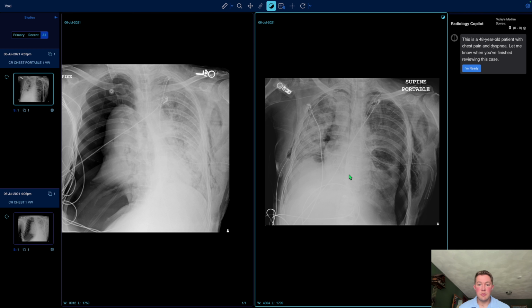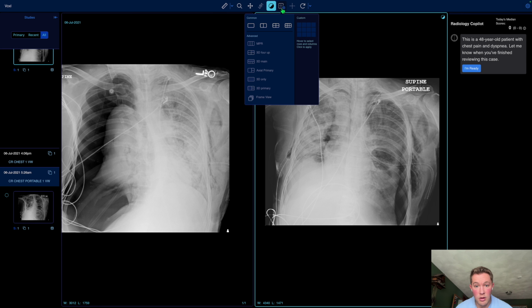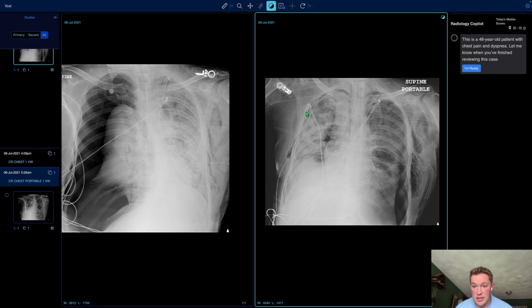Yeah, so you can see that the team quickly placed a right chest tube, and the right chest tube is ending at the apex of that right lung. The lung has started to re-expand, and it looks as though it's almost entirely re-expanded to me. But you can see that there's the re-expansion pulmonary edema throughout that lung, to be expected afterwards. But there's also some of the soft tissue air on the right lateral chest wall, a little bit less than there is on the left lateral chest wall, but there's still that soft tissue free air.